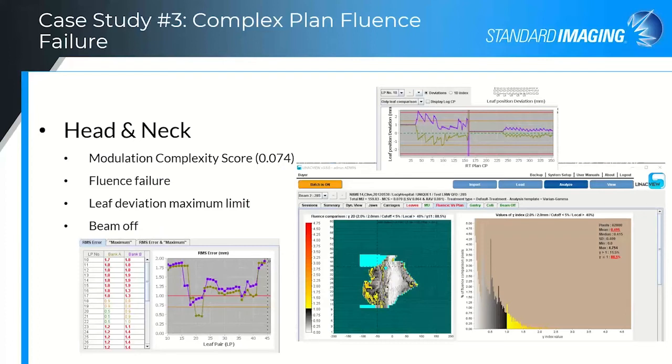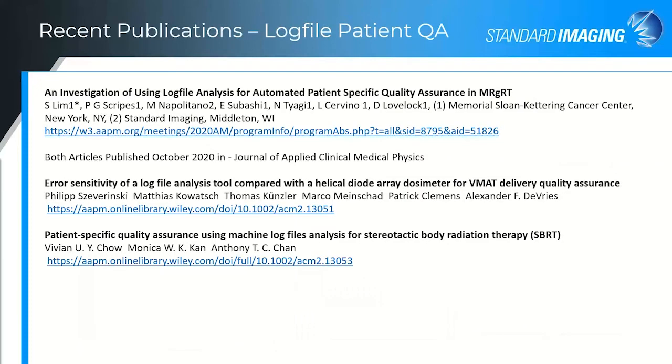And so now I'll continue on with the presentation. You could see the dashboard, what was shown for the failure, and then you can go in and investigate further for this particular plan, for example. If you would like to see the software in a bit more detail, please just reach out to me and I'll be happy to show you all the detail available within the software.